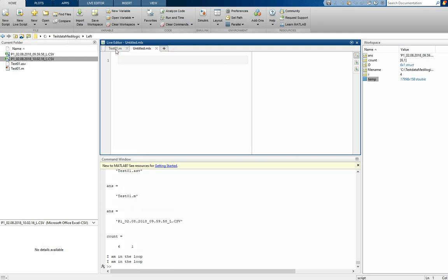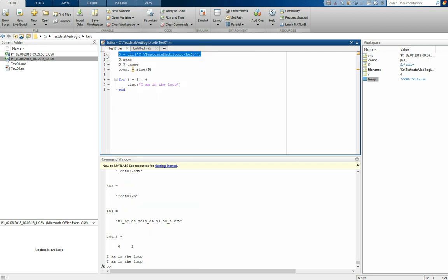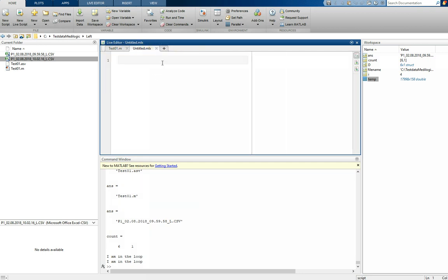And when you're in there you can also type that one in the same case, and by hitting Ctrl Enter, you get the result out of this single line. It's easier to read in the Livescript because you have the answer on the right side and the commands on the left side.